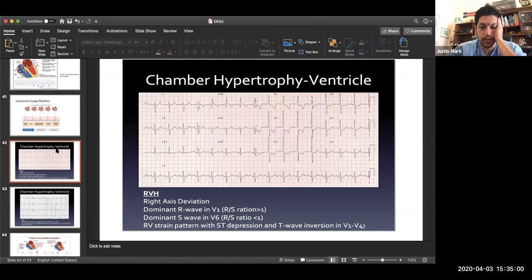All right, we'll talk about this now. We'll talk about the hypertrophies. So I know it says it here, but let's start. We'll skip the rate. What's the rhythm?